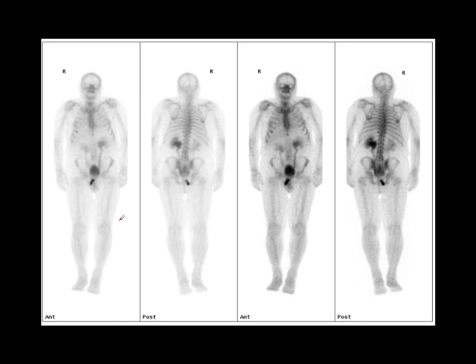So this patient has bilateral hydronephrosis, both ureters are dilated, the bladder is distended. We have to think they might have bladder outlet obstruction. Now that could be due to prostate cancer invading through the posterior capsule and grabbing both ureters, grabbing the urethra. It could just be due to benign bladder outlet obstruction, but clearly it's something that we need to note in our report and possibly let the clinicians know about straight away.